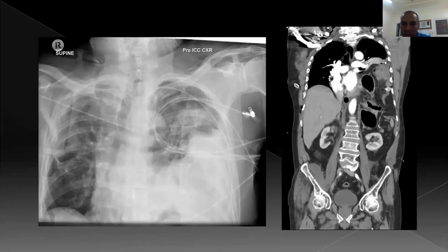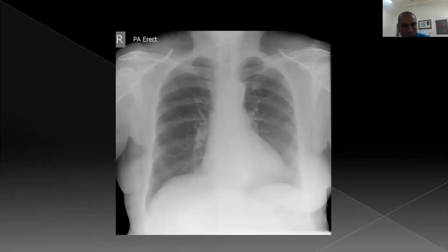Yes, you are right. This is the CT for the same patient, and this is diaphragmatic rupture, one of the most important signs you can suspect by chest X-ray. So we are now discussing behind the heart, below the diaphragm, and the third B, the breast.